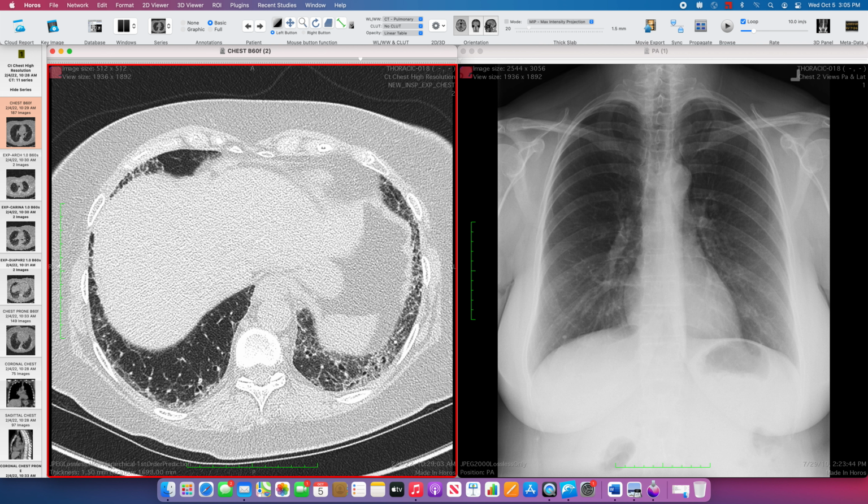by our imaging criteria, and has a greater than 90% likelihood that if you were to biopsy it, it would be UIP. And in the appropriate clinical setting, this would be consistent with an IPF. That patient, even though they have a UIP pattern, would still need to be worked up for underlying causes such as connective tissue disease. But altogether, this is a UIP pattern, and when there's no evidence of an underlying cause, is consistent with IPF.